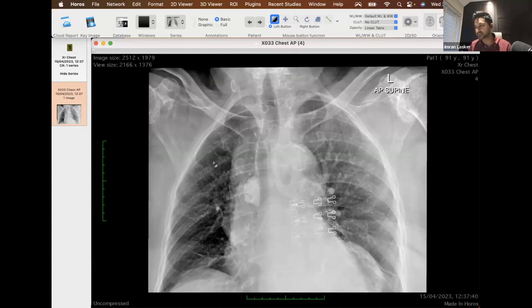There's something else like Castleman's disease, a bit of an odd disease. I can't remember what it's like. You can get a singular enlarged lymph node adjacent to the mediastinum or esophagus that can cause calcified lymph nodes. Interestingly, I remember reading that in the abdomen, you can get calcified lymph nodes as a result of having non-pasteurized milk. I don't know how that would happen in the first place, but you'll see articles written about that kind of thing. But anyway, when you're looking at this X-ray, you can't see anything else really going on.